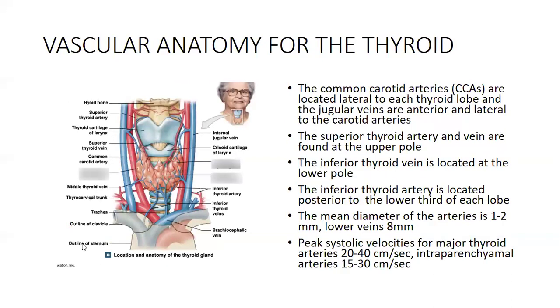Now, you realize that the thyroid is a small organ, actually, but very highly vascular. And because of its high vascularity, and how that vascularity affects the dynamics of the ultrasound imaging of the thyroid gland, it's important for us to highlight the vascular anatomy of the thyroid.